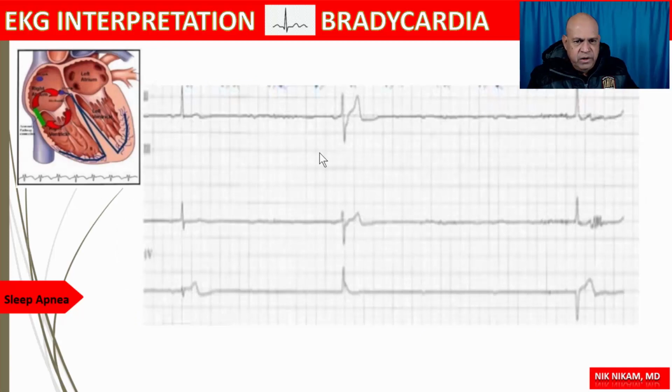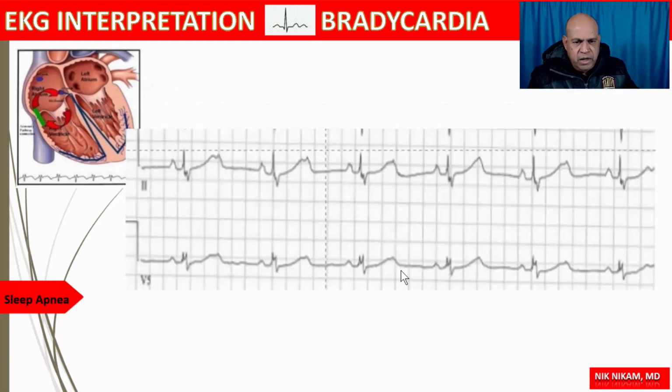Here's a supraventricular beat with a different morphology, and here's another supraventricular beat. Take a moment, look at this strip, write down all the points, then we will continue.